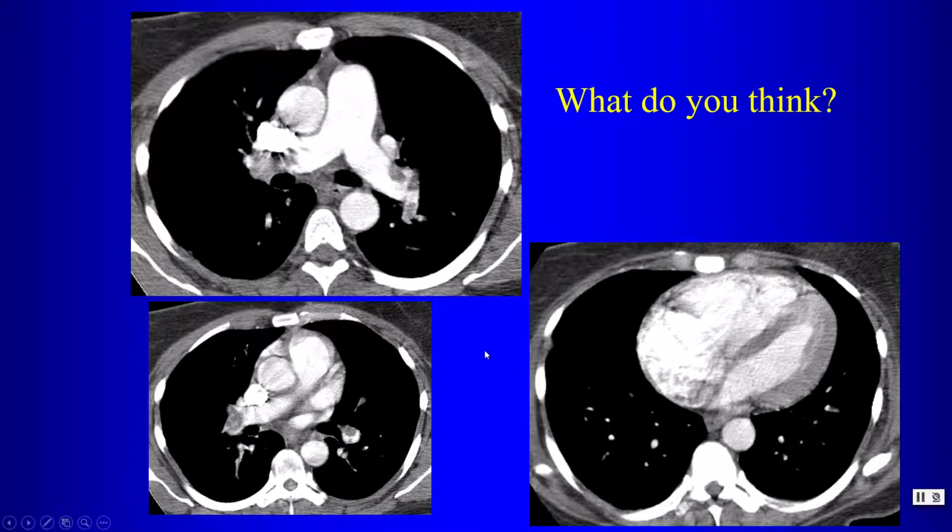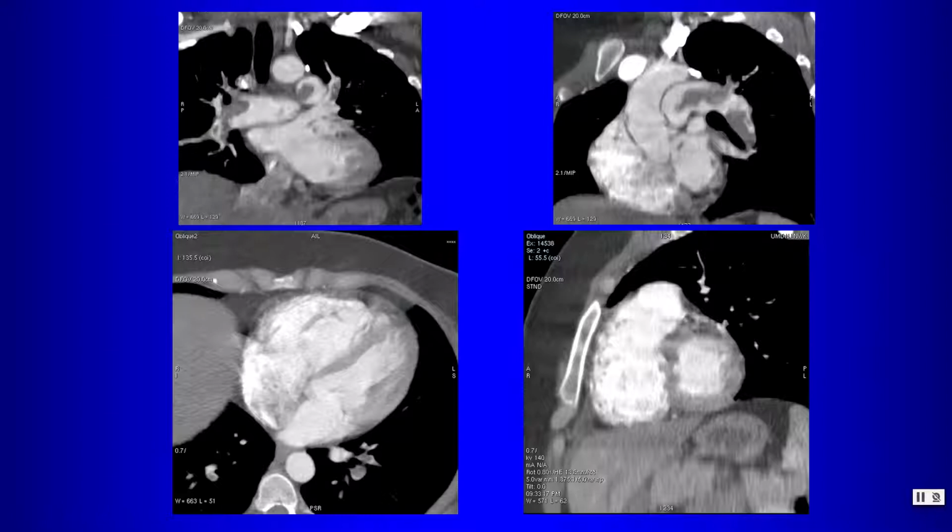Patients with right heart strain need to be treated more aggressively since they are at higher risk for morbidity and mortality from pulmonary embolism. Usually these patients have large central clots, as you can see here, and then here's the dilated right ventricle, dilated right atrium, and on this short axis view we can see the dilated right ventricle in this patient with right heart strain.